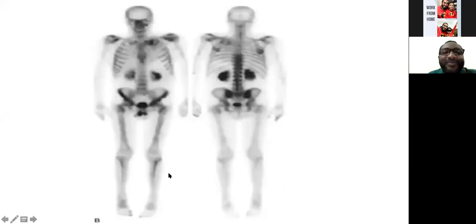According to the osteoporotic phase of Paget's disease, as the osteoporosis circumscripta of the skull, how does it appear on the bone scan? Will it take up the tracer or appear as a cold spot? The circumscripta will appear with intense uptake, but with a central area of lucency. So you will see intense uptake with expansion and some form of deformity, but the central area will look photopenic, even if it is the osteoporotic phase. Yes, even if it is. Thank you. All right, good.